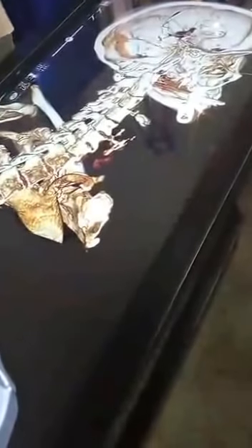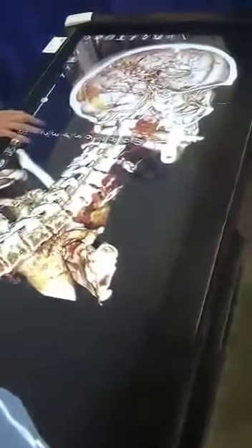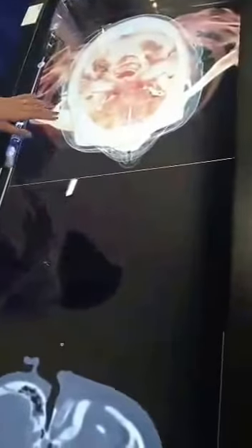And same functionality as before. You can go ahead and make a quick cut into the 3D model and see where the clips were placed as well. So it's kind of more intuitive when you see something in 3D, where the clips were placed rather than just focusing on a CT. And then you can also add in some vasculature if needed. And you can also bring it back down. There's other ways where you can utilize this, where I bring in transparent soft and hard tissue. And so in this case, you still see where the clips were placed.